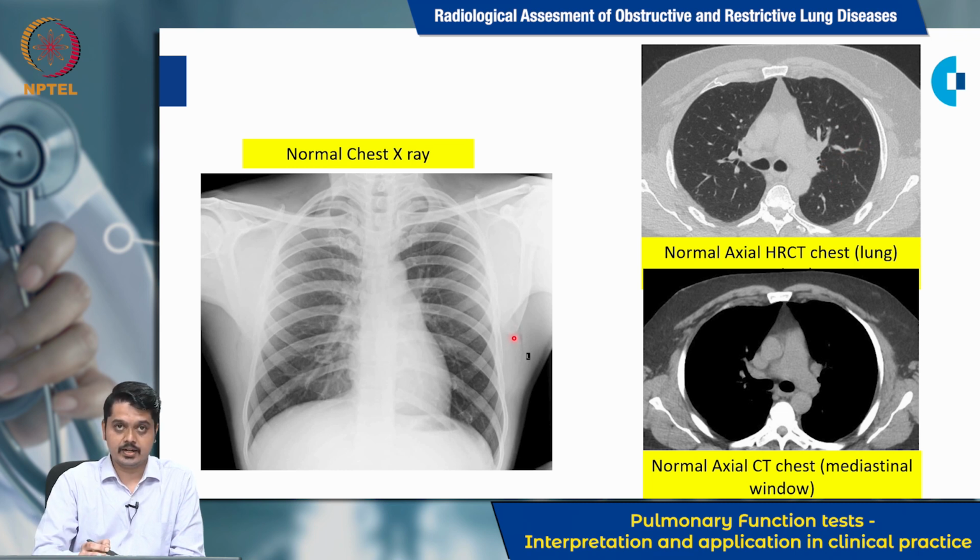There are certain hidden areas in X-ray chest. Number 1 is apex, number 2 is hilum, number 3 is retrocardiac area, that is the area behind the heart. Number 4 is the area around the diaphragm. Opacities in these 4 areas will not be well seen in chest X-ray.